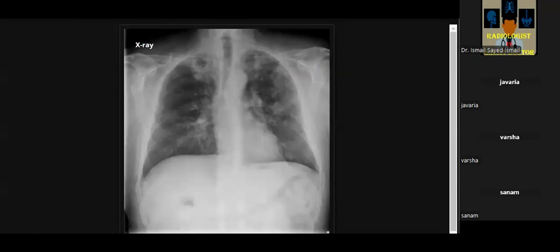Yes. I'm presented with a radiograph, chest frontal projection, of an adult patient in which I can see an area of nodular opacification involving the left lung, predominantly the upper and mid zones. I can also see circumscribed rounded opacities with central air lucency in bilateral apical regions, concerning for cavity formation. There is relative sparing of the bilateral bases.